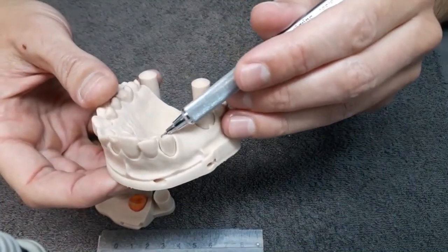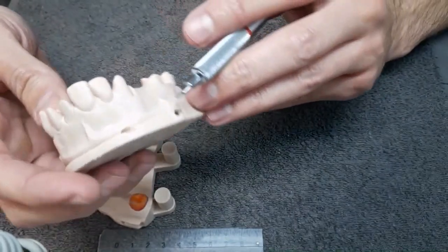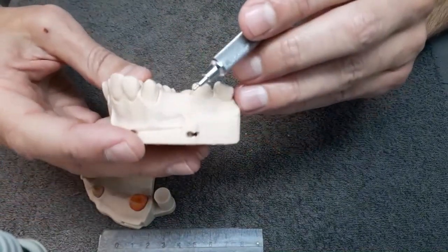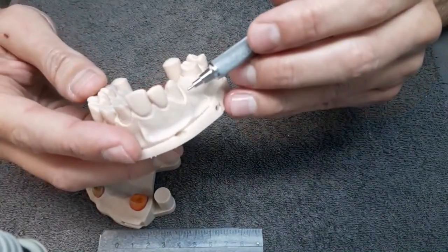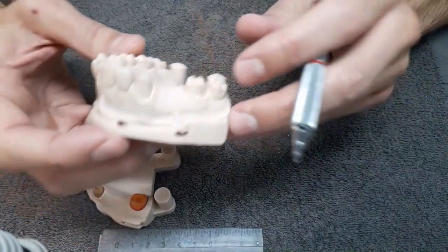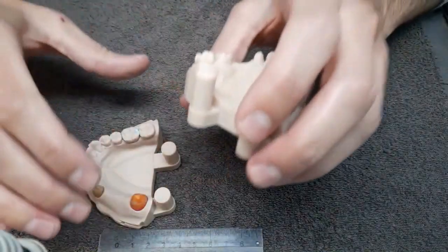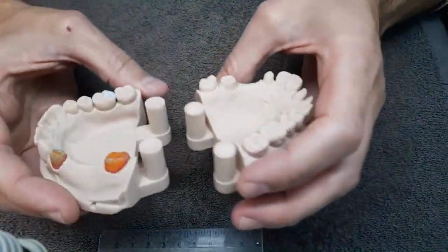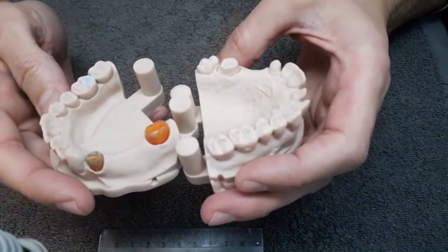You keep the gum around the tooth, but nevertheless, you can remove the die and see very nicely the closure of your dental work, having the gum far from your die. Because you remove the die, but then you place it back and you see the relationship with the gum.